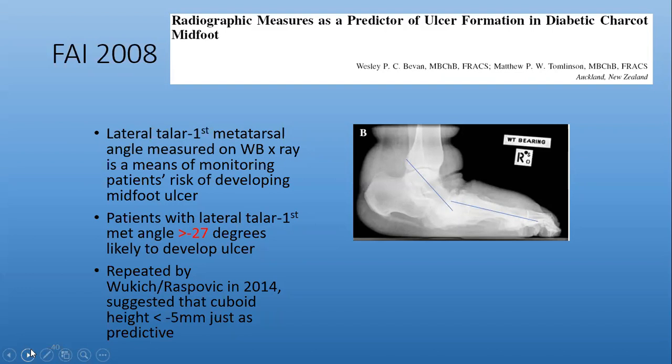What do you see with the calcaneus? It's a big deforming force in Charcot, the calcaneus. The heel spur. It's very elongated, like in a plantar aspect. Okay. What about the inclination? It's decreased significantly, right? It's probably negative if we draw these out. Yeah. So equinus is a large, big driving force of this midfoot collapse of the Charcot.